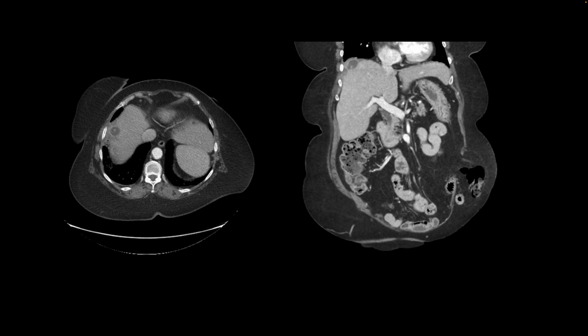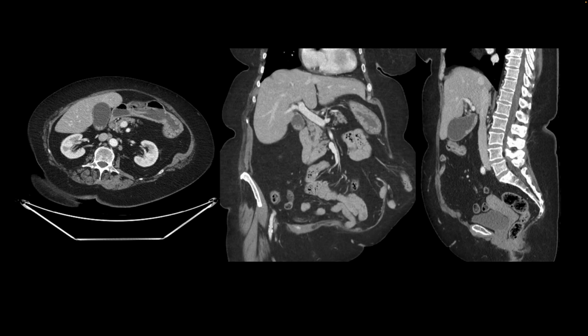Here is another interesting patient who presented with abdominal pain, and their CT of the abdomen and pelvis showed multiple hypodensities around the liver. One of them is shown right here, and the same one is also shown right here in the coronal image. There were others too, and all of these densities showed an internal focus that is hyperdense inside. And compared to their prior CT scan, which is shown right here, those central foci looked like these gallstones that they had previously.